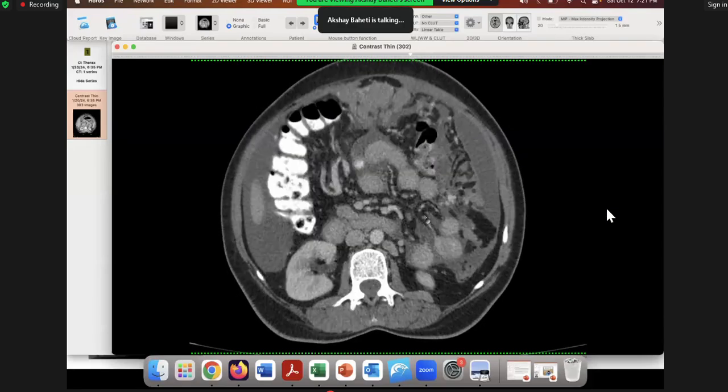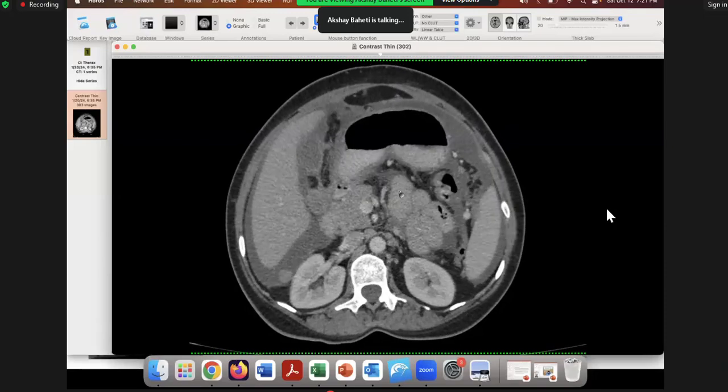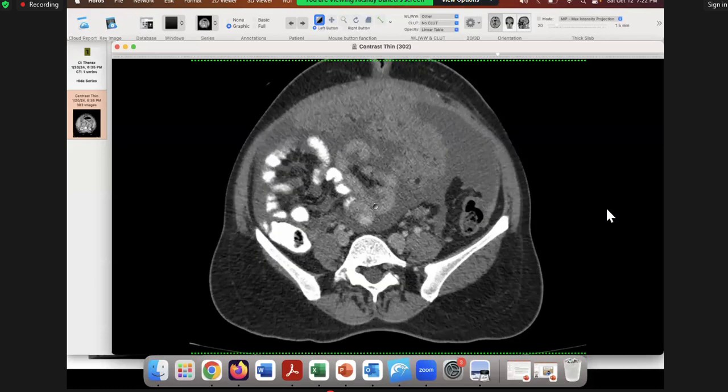Fine. But how do you trace it? I can make out here's the DJ, and I can make out that the IC is maybe somewhere here, right? But how do I know what is happening here? Is this root or not? Is all of this root? What is root? It gets a little difficult, right?